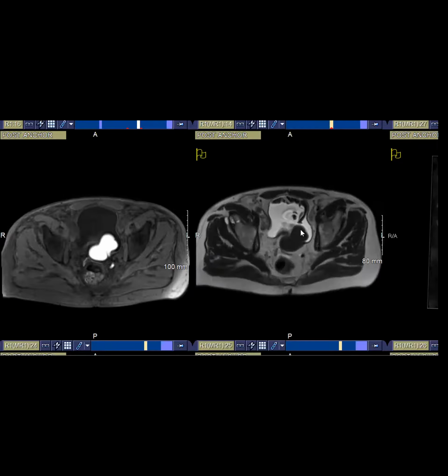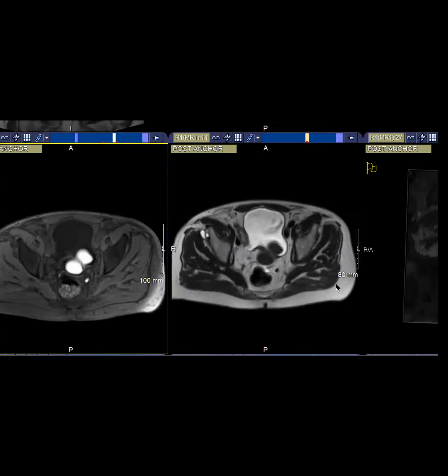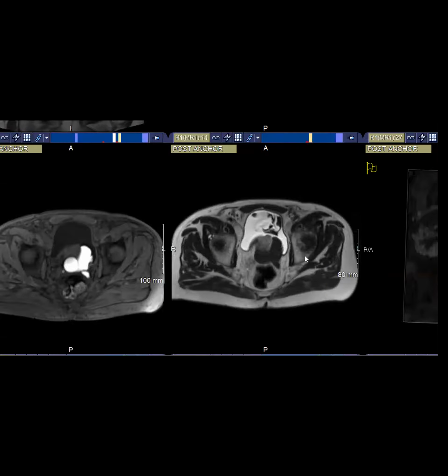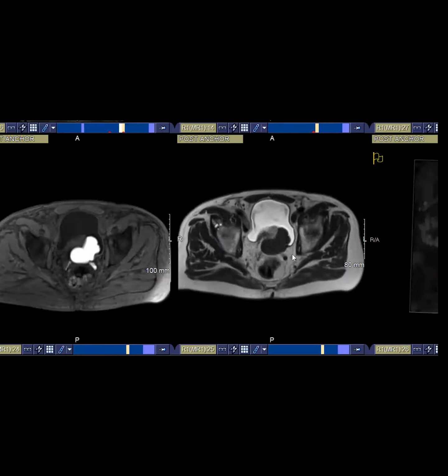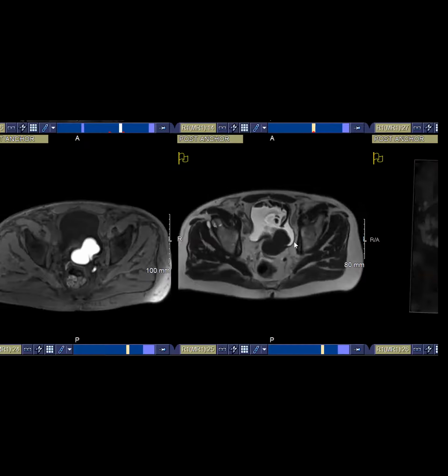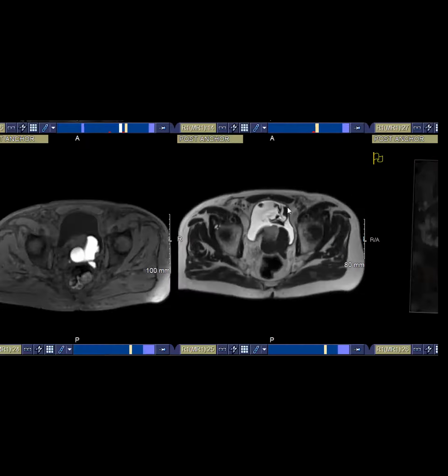It's more commonly described in the brain with blood degradation products. Victoria, you must tell me, but I haven't seen this phenomenon very commonly in the abdomen. For the pelvis, it's described in endometriomas. It's a common phenomenon in fibroids, because they start out with such low signal intensity on T2. So that's one of the pitfalls for ADC in pelvis.